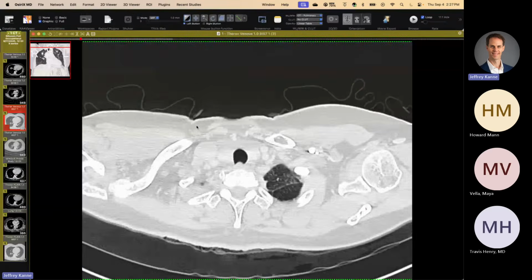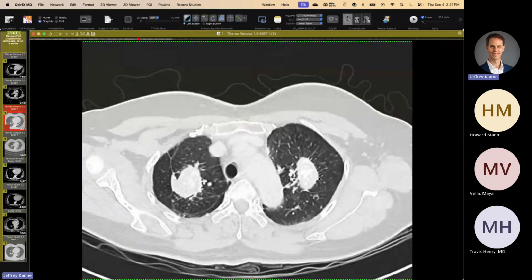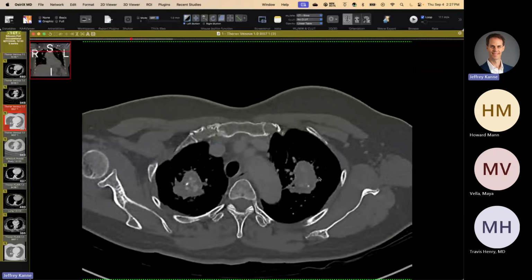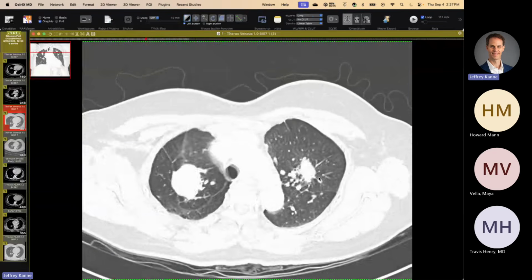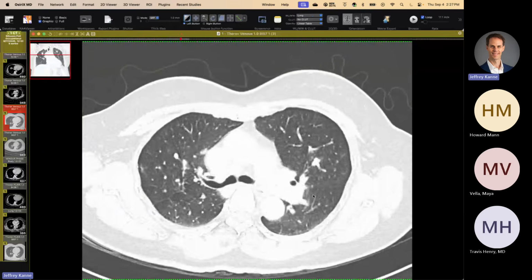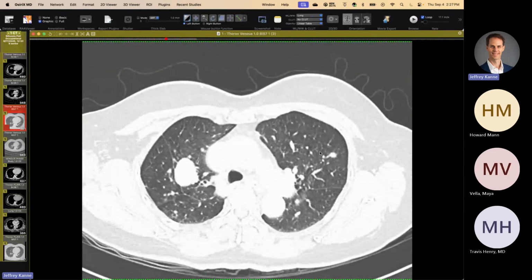58-year-old woman who carries a diagnosis of progressive massive fibrosis. She's got these large masses. You can see, there we go, they are calcified in the middle. There's really no lymph node enlargement or calcification, but if you look on the background, there are small little nodules, some along the fissures, so some perilymphatic nodules here. So the differential is sarcoid, and then of course pneumoconiosis, a couple larger nodules.